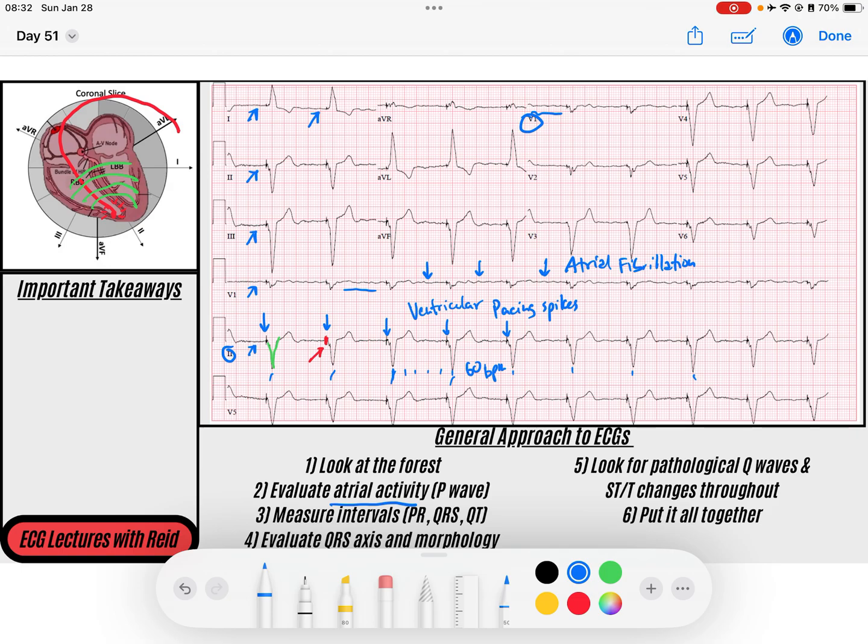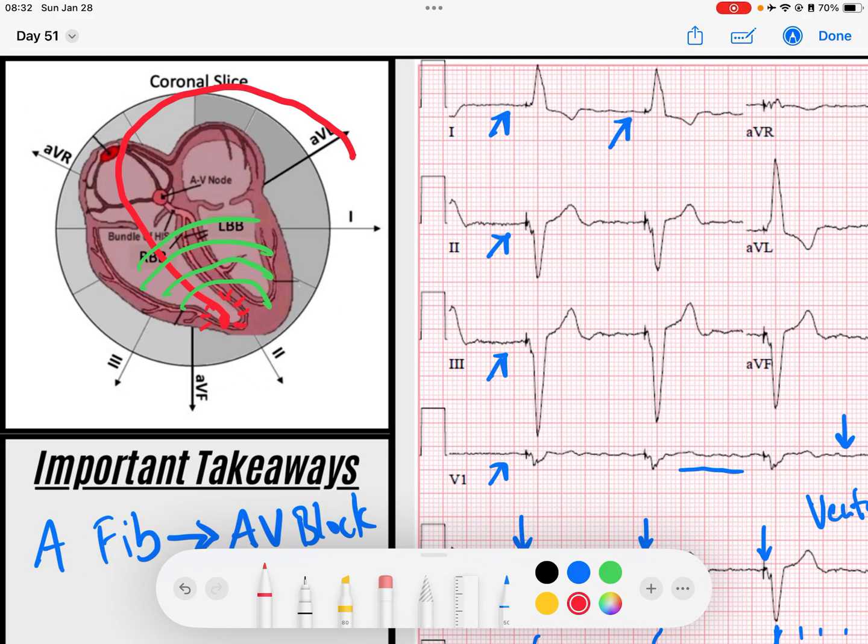And we think of atrial fibrillation, well, it's usually irregular, but in the setting of a ventricular pacemaker, this atrial fibrillation is not going to cause that irregular rhythm. So likely what's going on with this person is this person has AFib, but they also have an AV block. How do I know that just from this ECG? Well, we know that they have a ventricular lead in their ventricles at a minimum. And usually when AFib is going on, we've got these fibrillatory waves going throughout the atria, and they're bumping into this AV node, and the AV node can take it and send it down.